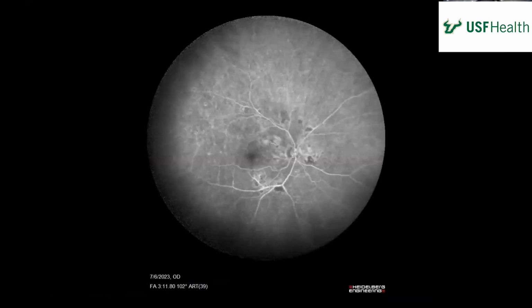Yeah. How about the ultra wide? Anything strikingly different there or not really? What's the same? It's the, I guess, FA. It looks like it's perfused down the periphery. You disagree? Yeah, no, no perfusion. Yeah, everything looks good, and you can still just see those areas of blocking there and then some leakage areas here as well, but everything looks pretty well perfused in both eyes.